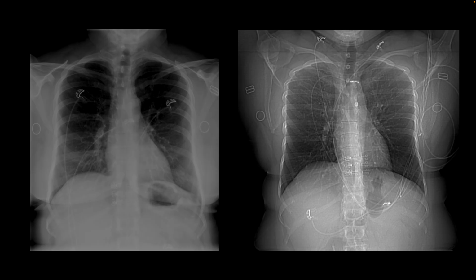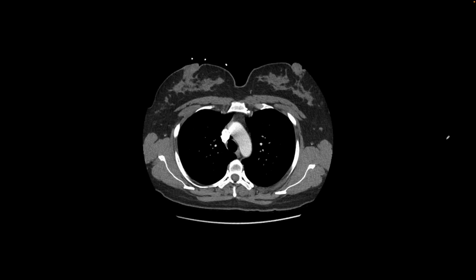And here's the companion case where an abnormal density was reported on this side. I will outline the density right here, and then I will outline the breast shadow. And so a nodule was suspected and a CT was performed. On the scout image, we don't see that density, and on the transaxial images, there were no lung nodules, but these large nipples are seen bilaterally.